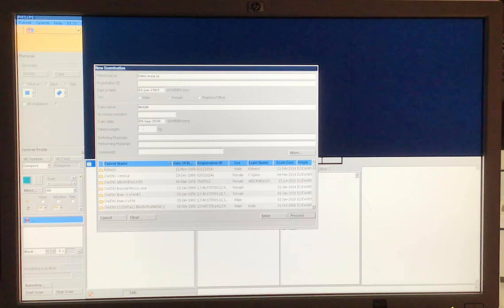So we'll just go ahead and let's say in my dream, I weigh about 110 pounds, right? So that comes to 49.5. I cannot put decimal points in, so I'm going to round it up to 50 kilograms. My referring physician will be what's written on my order, so it might be Dr. Smith. The performing physician we won't put down.